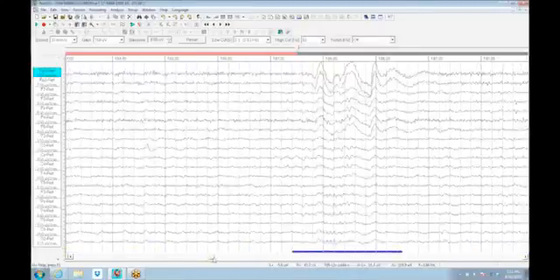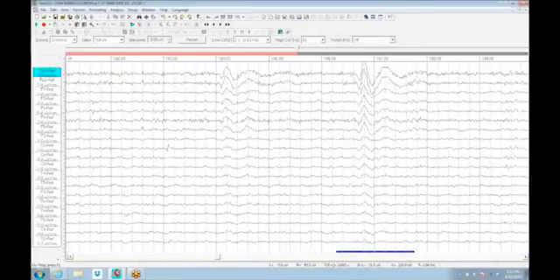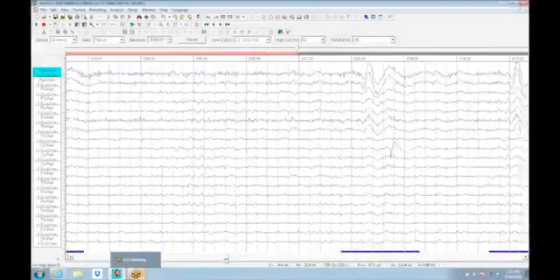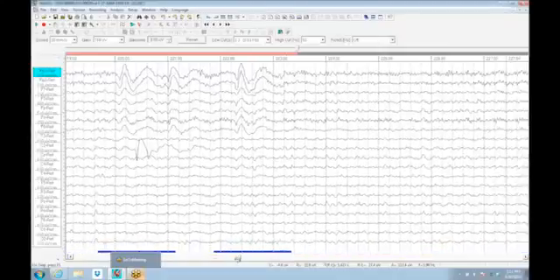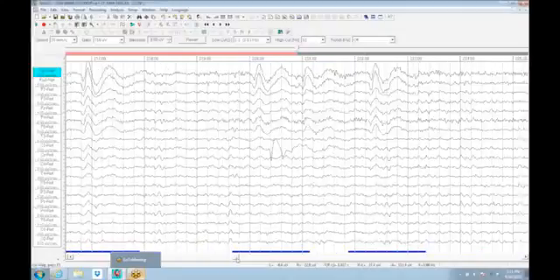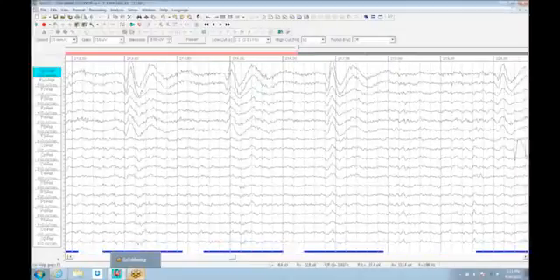Now, this is the more traditional marking of pieces that you'd want to throw out. And again, we'd want to end up marking all of these to throw them out to do a good job of it. But there's another approach that's available within this free software, and that's to end up identifying all of these eye movement related components and to zero out that component so that these are extracted, leaving this piece of EEG, which other than the eye movement has got perfectly normal, healthy stuff you'd want to analyze in it.